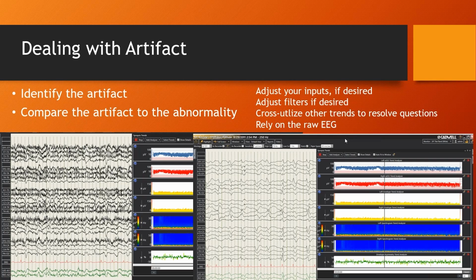In this record, we're going to see it likely all the way throughout, but I would register in my brain that in this particular record, that peak or that gap in the amplitude integrated EEG does not necessarily conflate with an abnormality, but it's likely to conflate with an artifact.